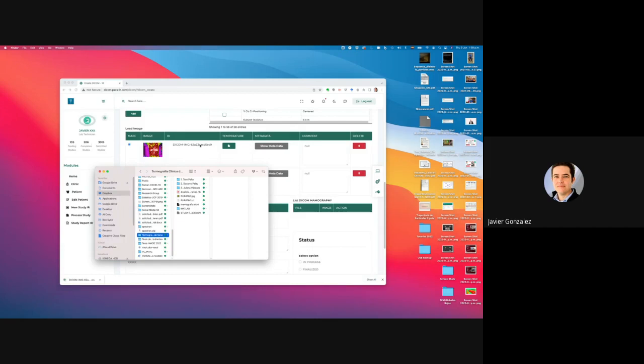The Google web application we're using has a medical module that is already HIPAA compliant. So that's why the handle looks so weird. It doesn't have any information from the patient. It gives you a weird handle for every patient, and that's for HIPAA compliance.